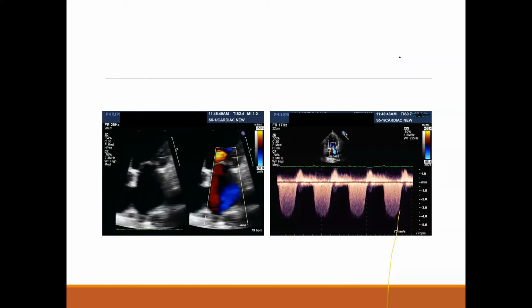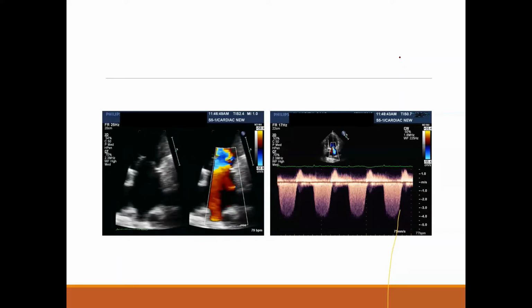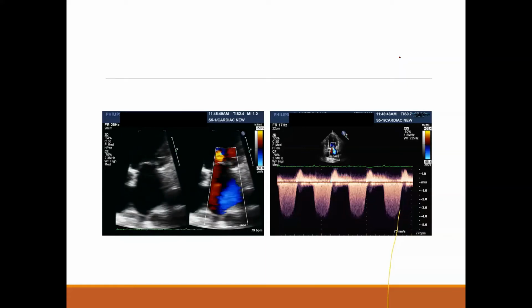You need more information. The color flow mapping sometimes is dramatically severe, undisputably severe, unequivocally severe, and nobody can conflict that. But sometimes it might look moderate and it is severe. Sometimes it might look severe and it is not really severe. So for the color mapping itself, don't rely heavily on it. You have to have more objective ways of assessment. Eyeballing of the jet itself might mislead you.